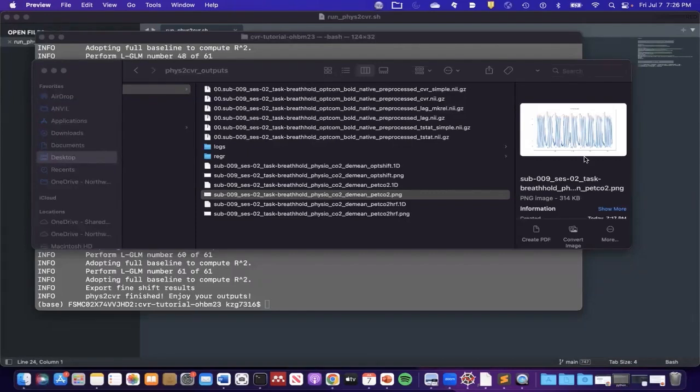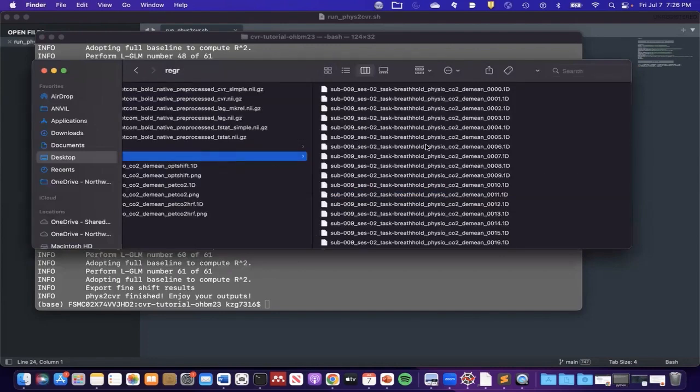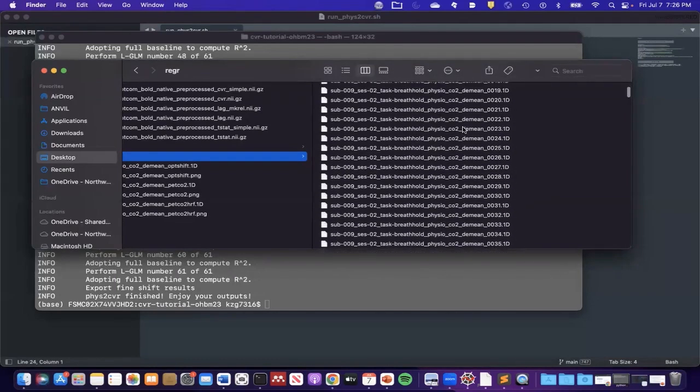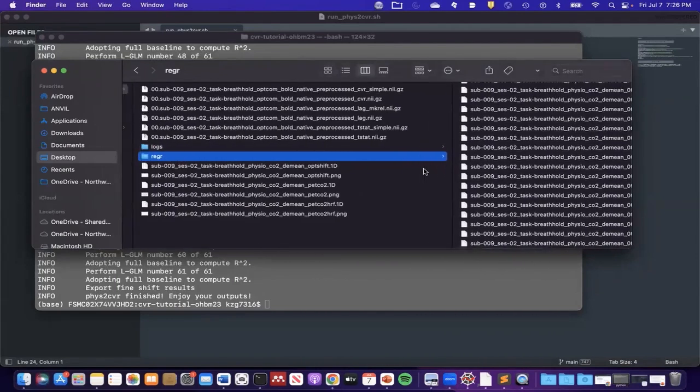I normally use the red to yellow as the positive color bar, and then we want to indicate that we want a negative color bar, and then we can actually toggle on the color bar to specify that.